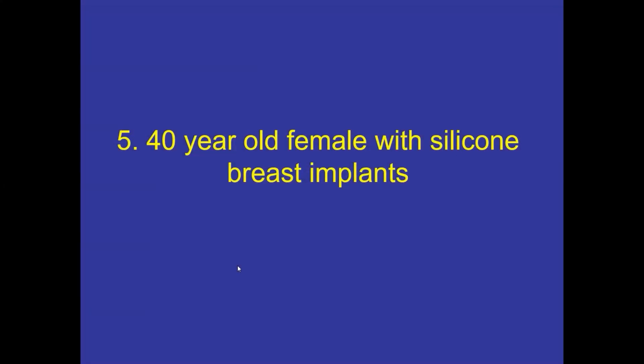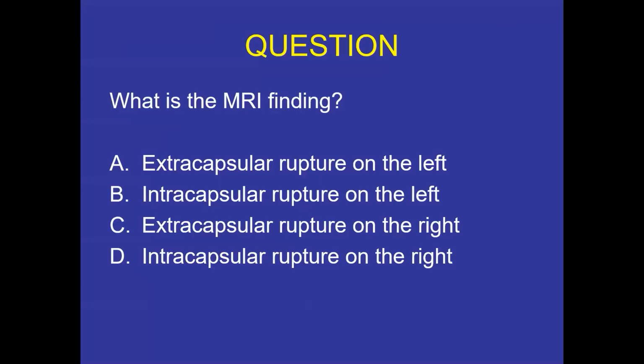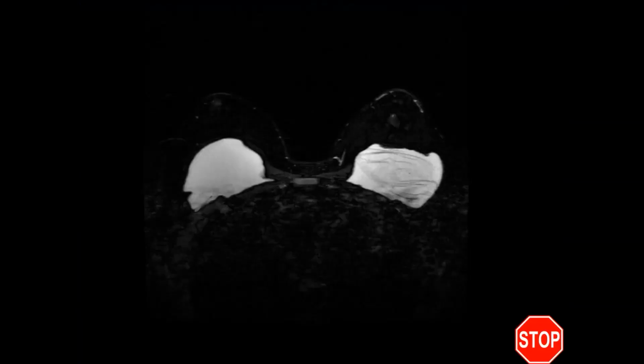40-year-old female with silicone implants. I will go to the question and then scroll back for you. Excellent. Intracapsular implant rupture on the left. Wonderful. I just realized I probably should have put a left-right marker, but you can vaguely see the heart to help you.